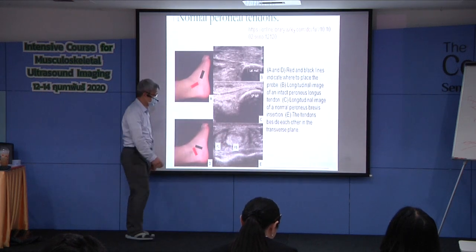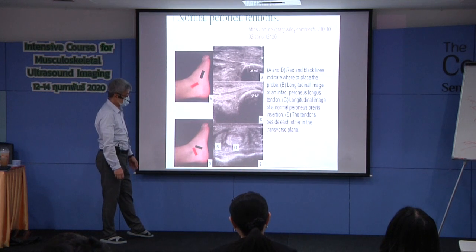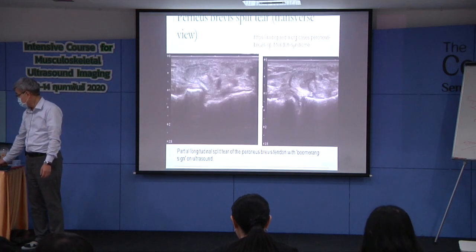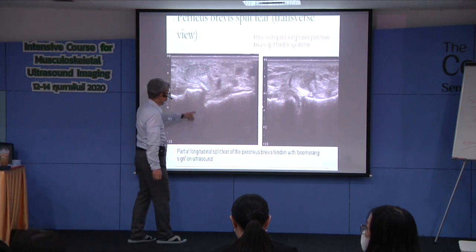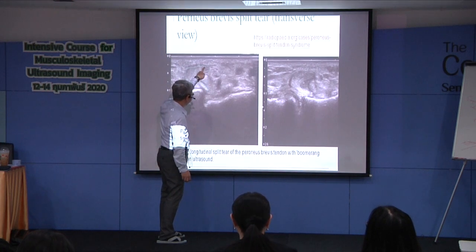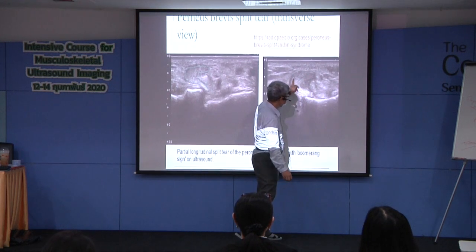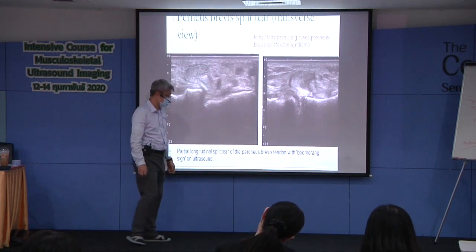So the interaction between the longus and the brevis is very interesting, but not a lot of research discusses this. Right. And if you find the details in the brevis changed, and there is some fluid around the tendons, that means tendinopathy or tendon tear.